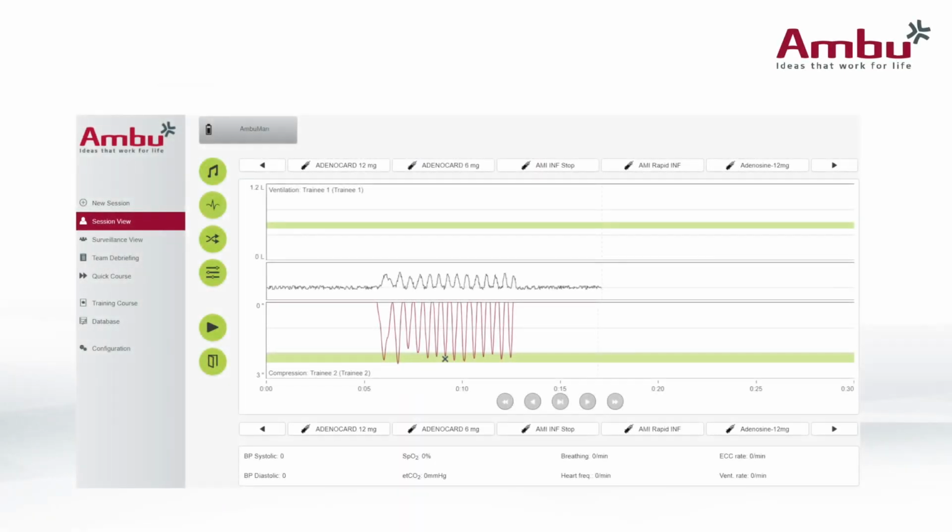The session view is a split window for the instructor. Here is where the instructor will be able to view the session in real time, getting feedback from the trainee. There is a function menu to the right where changes can be made to the manikin on the fly during the session or scenario, such as changes in breathing, changing an ECG rhythm, updating a clinical parameter, or switching the student that's being tested. The performance graph of 2 trainees is displayed at a time to show compressions and ventilations. This allows the instructor to select events conducted during the training.